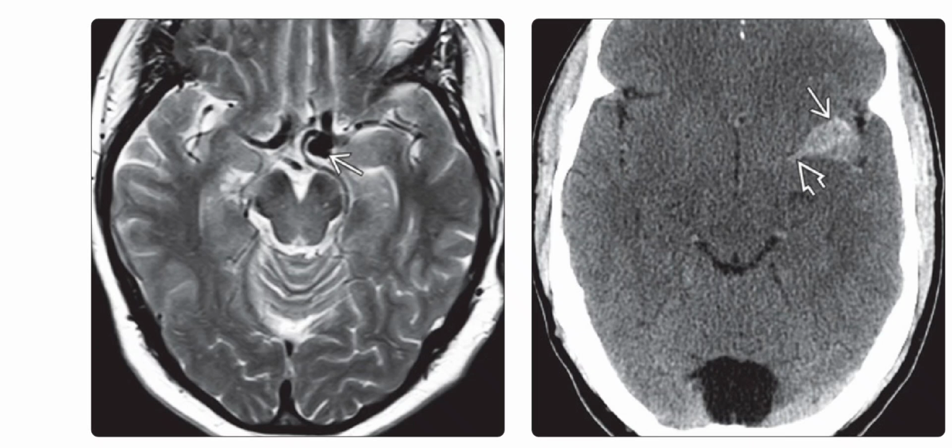The right image shows thrombosed saccular aneurysms can appear very hyperdense. This patient presented in the ER with sudden onset of right hemiparesis. The non-enhanced CT scan obtained as the initial study in the standard stroke protocol shows an ovoid hyperdensity with what appears to be thrombus in the left proximal MCA.